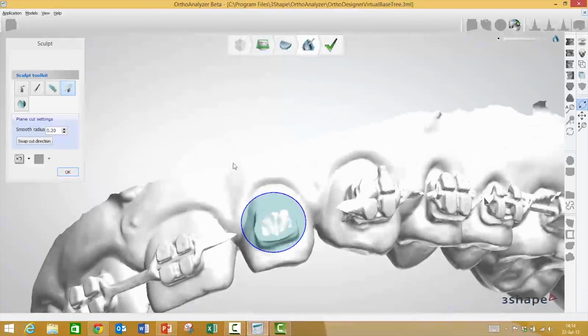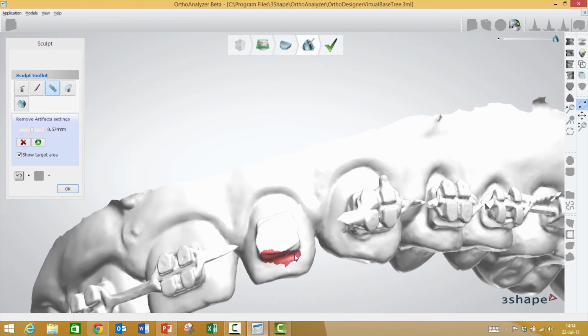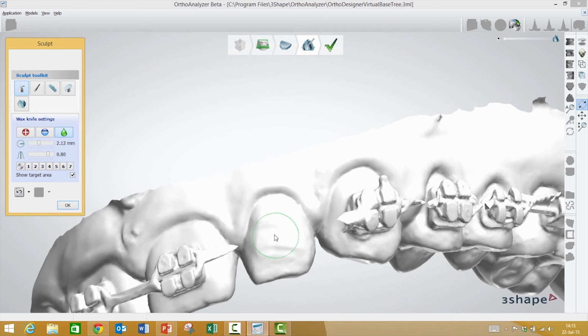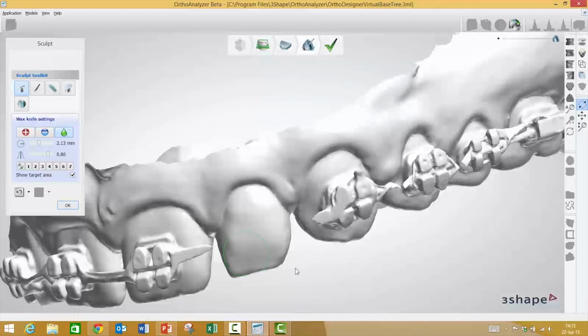And if I turn it over now, you can see I will over here go to remove artifacts, and then I will draw around. Basically what you did before. Basically what I did before. Okay. Completely the same. Press play, apply, and then I'll go to my sculpting tool, activating this one here, and just simply smoothen the tooth up. Pretty, so cool. You have a nice result of the debonded bracket. Very nice. Yeah. Thanks, Reike. You're welcome.